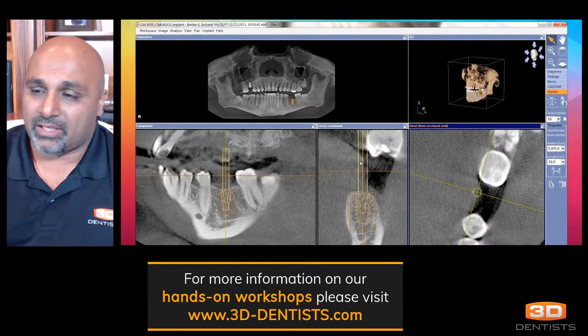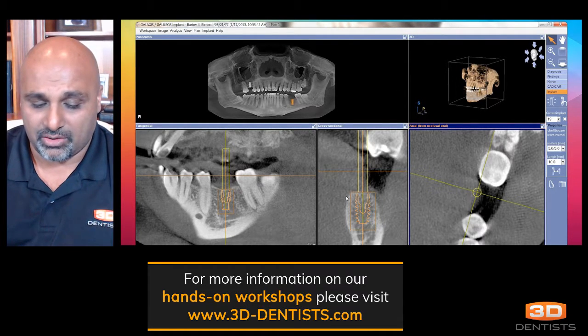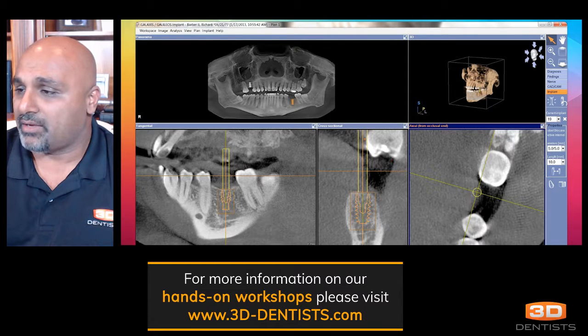And the other thing that you can take a look at here is that right here we can see our upper tooth is there, and our implant is actually going lingual to our upper tooth. And the other thing that can give this away is in the tangential view, you're not seeing any upper teeth right here.